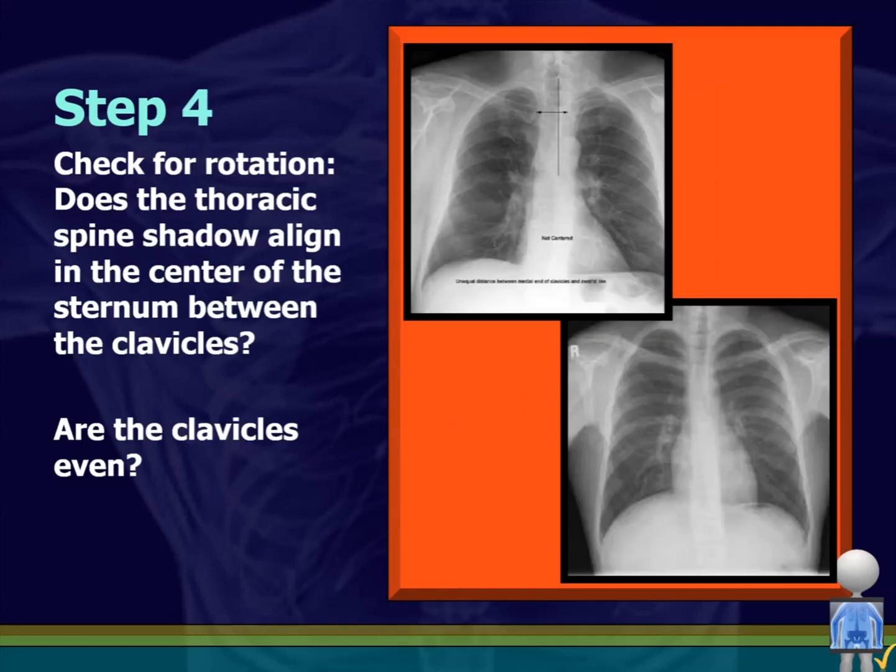Step 4 is to check for rotation. Now, rotation means, did you get a straight front-on picture? If I'm looking at the picture of the patient and they're sideways a little bit, they're rotated, they're not sitting straight up, but they're rotated to the left or right, or maybe they're rotated towards me or away from me with one of my right or left shoulders, it is possible for me to lose something in the area that becomes obscured because of the improper rotation, and that's dangerous, correct? Especially maybe a small lesion, but you might miss it completely. So we check rotation as well. And this is another situation where we might say to our staff, hey, I need you to recheck the film. I've got bad rotation. I need to look at it properly.